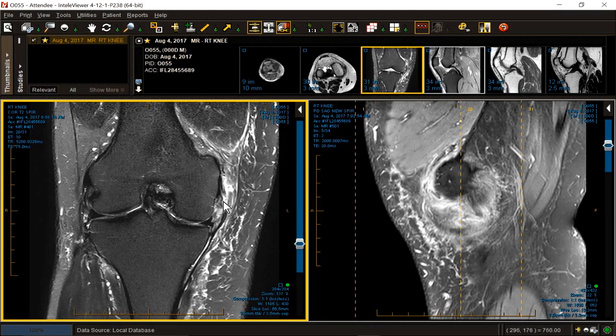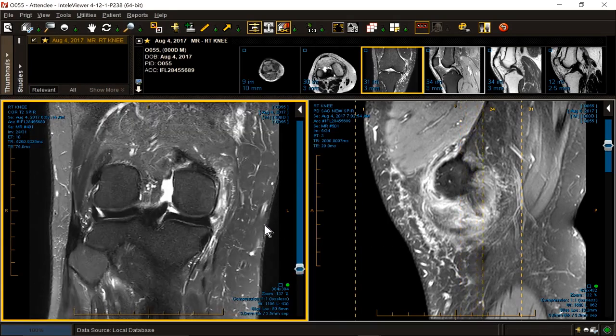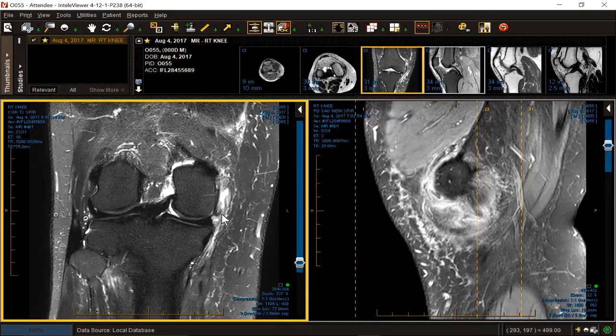Let's go deep. Layer number 3, the meniscofemoral ligament, it's torn. So there is a meniscocapsular detachment. And that detachment keeps going on to the back. Let's keep looking. It is still detached. Now, what is that little structure hanging on right there?